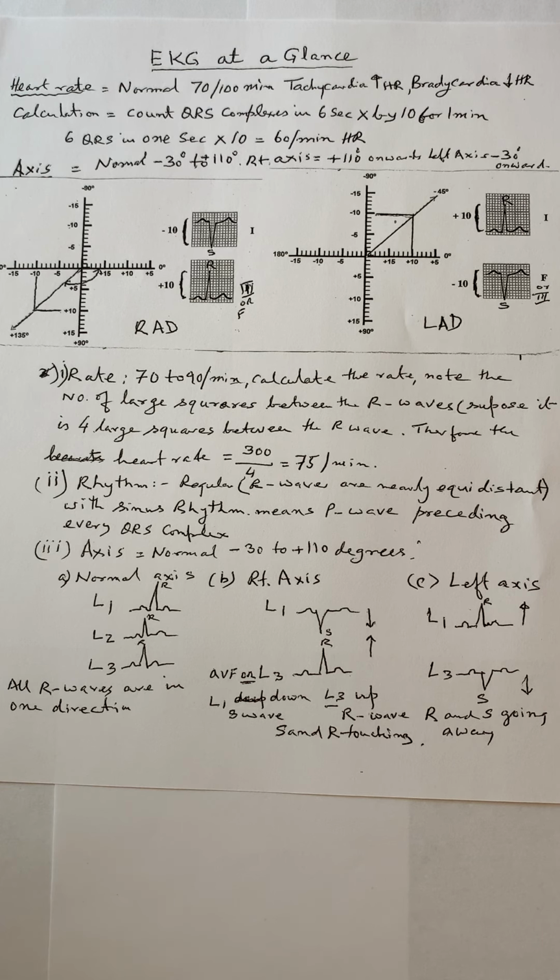Positive is up and negative is below, so the right side is positive, the left side is negative. So now you see positive 10. You draw a line, vertical, perpendicular. And then you see S is minus 10. Minus is on the upper side of the scale. See, minus 90 is written.